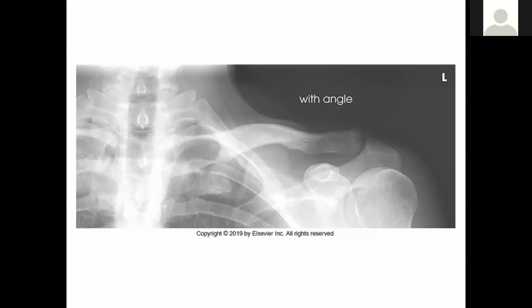Collimation-wise, we could tighten this up. Even with a cephalic projection, you should be able to align your central ray close to the clavicle, which on most people is prominent, even through clothing or easily palpated. You do not need all of this space over here. Marker placement, you have plenty of room above the shoulder off to the side for both AP and axial.